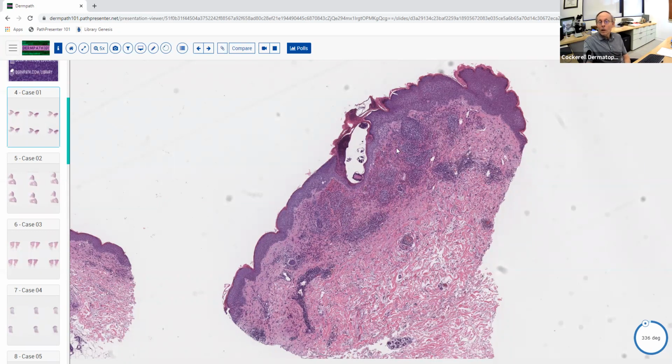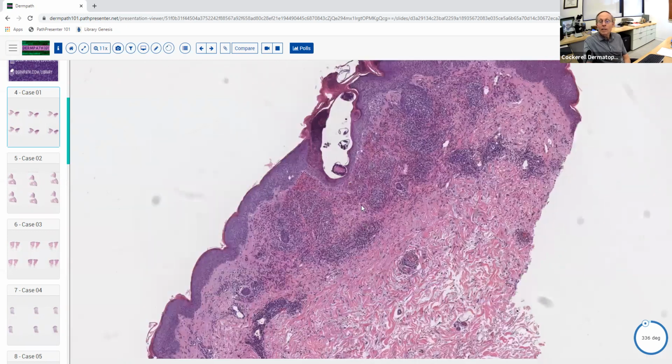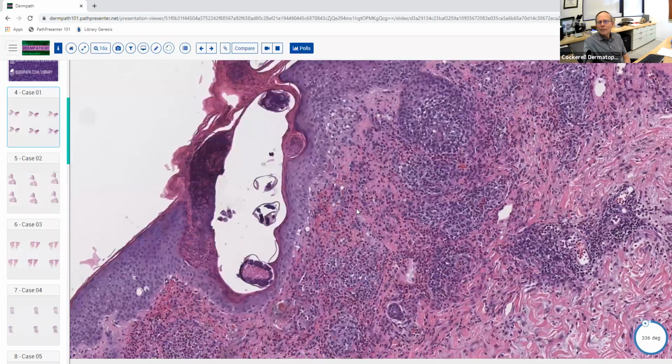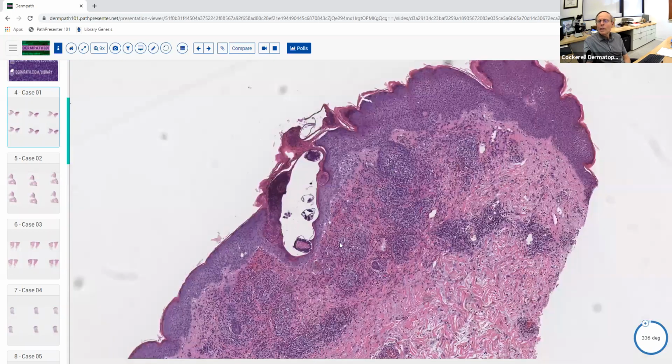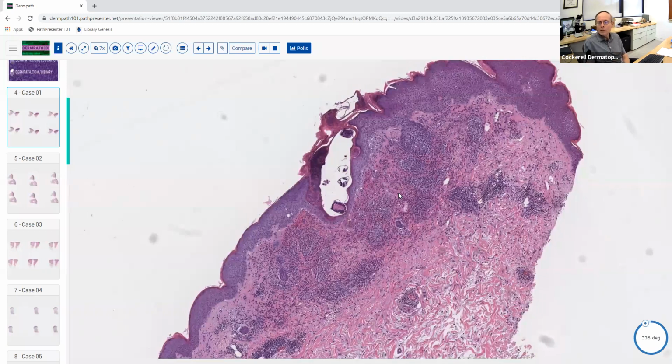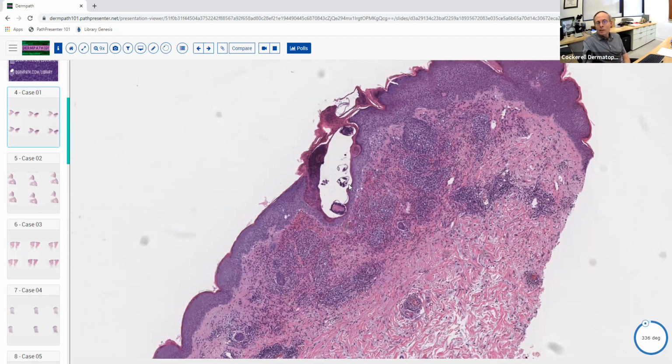But they often have a ton of eosinophils like we see here. So that's pretty characteristic. If you see scabies without eosinophils, that's pretty unusual. Most of the time you'll see eosinophils in arthropod assault reactions. There are some that cause more neutrophils, like fire ants and certain bed bugs. They can sometimes cause neutrophilic infiltrates, but as a general rule, we like to see eosinophils in arthropod assault reactions.